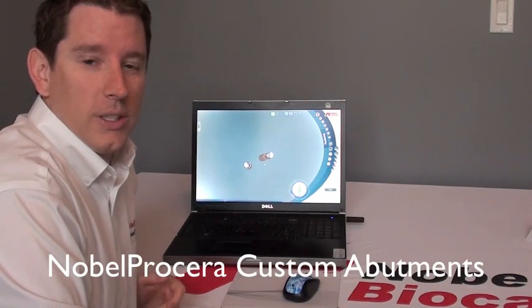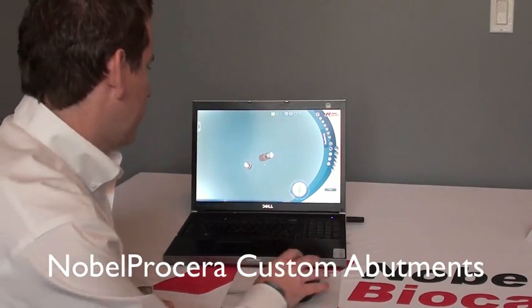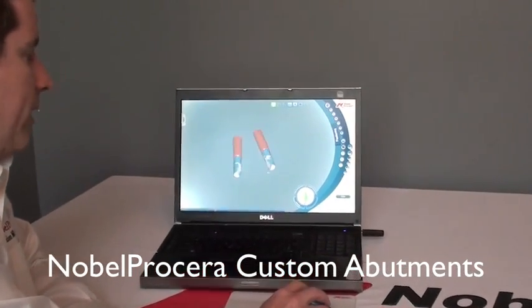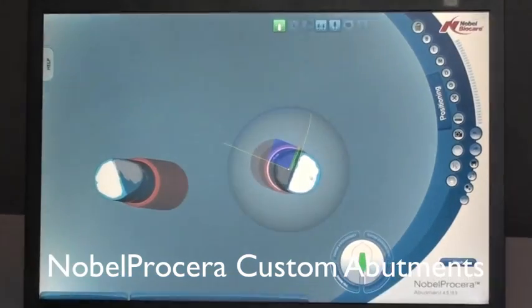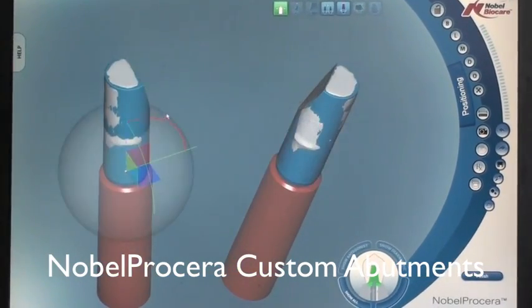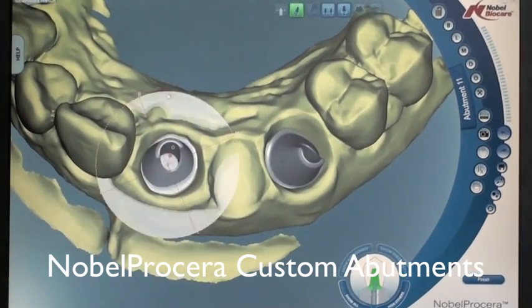Hi, my name is Jason Underwood and I'm going to show you how to efficiently design a NobelProcera custom abutment. So when the scan gets loaded into the design software, it has our positioning locators, and all we want to do is basically check to make sure they're aligned properly. From there we want to identify which side is our buccolingual, mesial, distal.